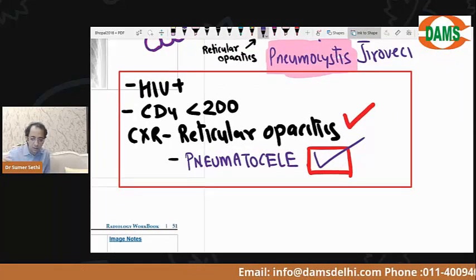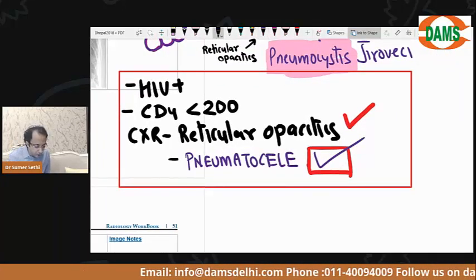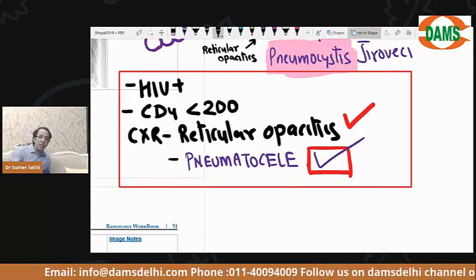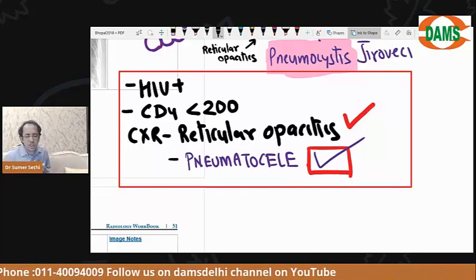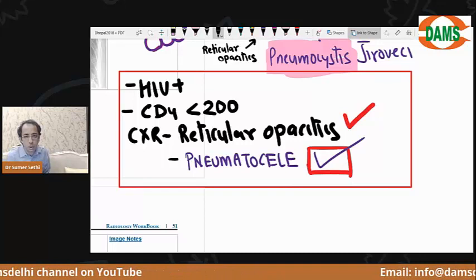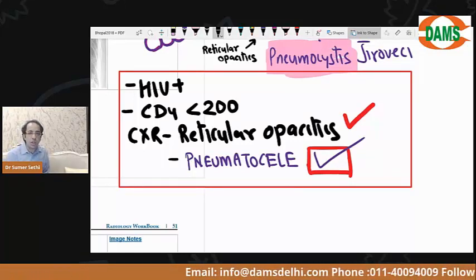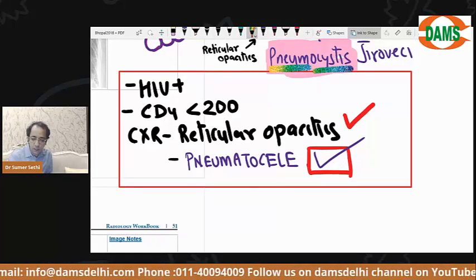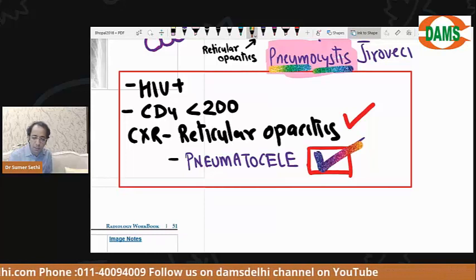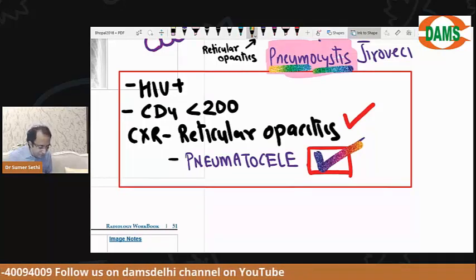Correct. But many people get it wrong in the exam because they come having memorized. Try and imagine: when you mug up that pneumatocele is seen in staph only, then you can't see what is in front of you. You miss out on the obvious. You cannot see what is directly in front of you, and that is what is required. That is called exam skill. In pneumocystis pneumonia you will have pneumatocysts. That is why it is named pneumocystis.